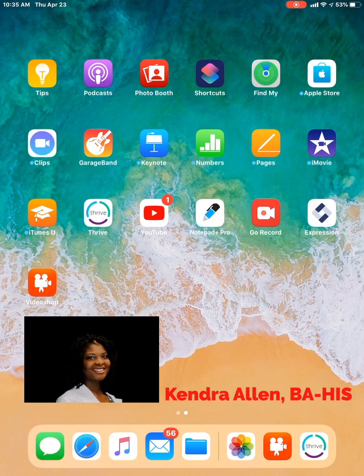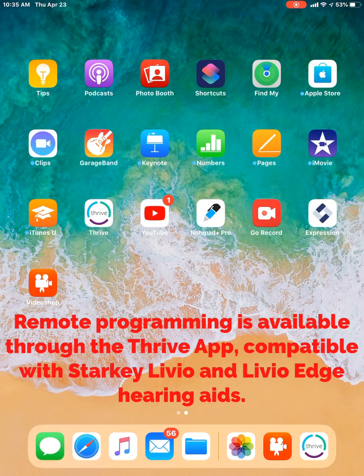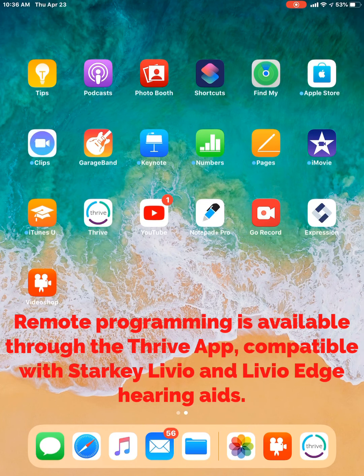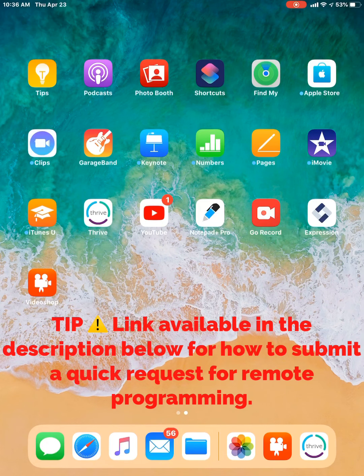My name's Kendra and I'm a hearing aid specialist. Today I'm going to walk through how to access remote programming in a more extensive way. If you're just wanting to access the remote programming in a quick request way, then check out my other video about how to do that.